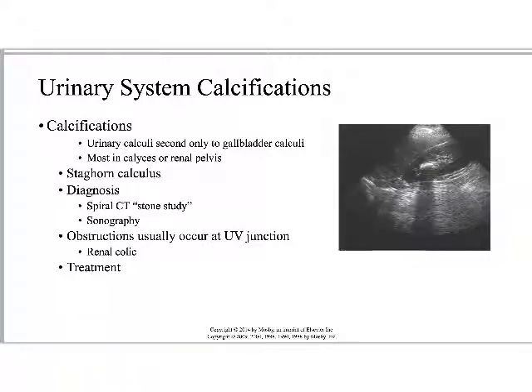But the stone study, again, to emphasize, no contrast. We do not need contrast to see this. The contrast would obscure it. With sonography, we'll be able to clearly see it if it's of sufficient size.